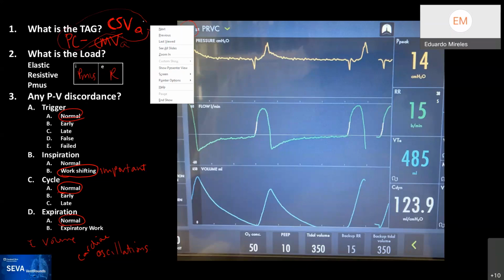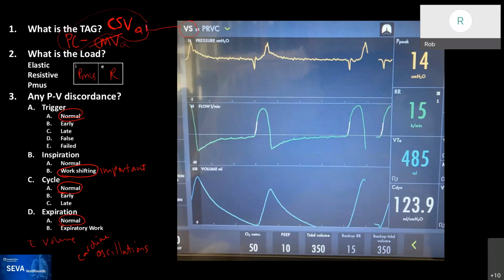Very good. So Eric made a comment. He said, "Can you say that is not a CPAP if you don't have the display name? This is an unusual spontaneous breathing trial on CPAP graph." Yeah, there's an argument there that there's no inspiratory support. Is that because it's on CPAP, or is it simply that the patient is sucking down the pressure in volume support? It's hard to say, right?